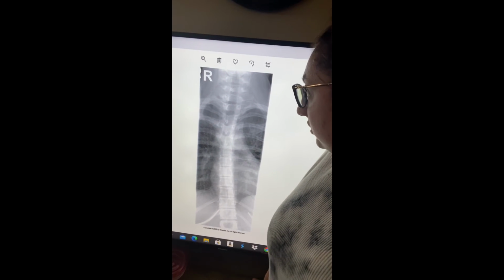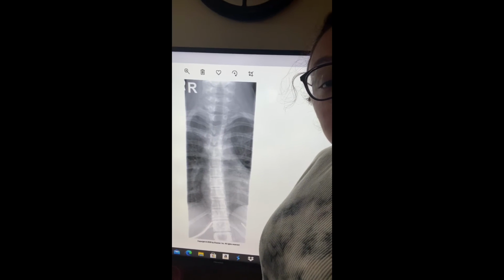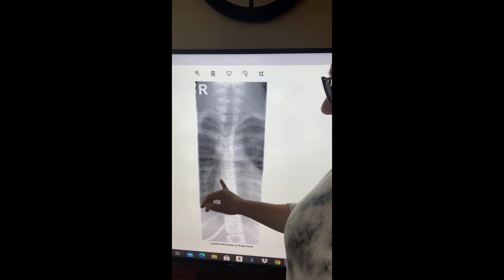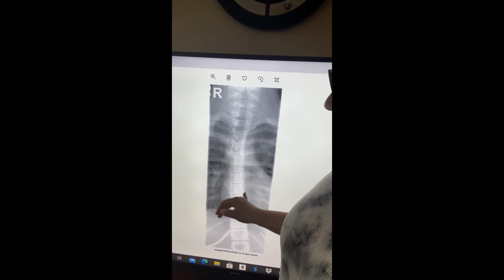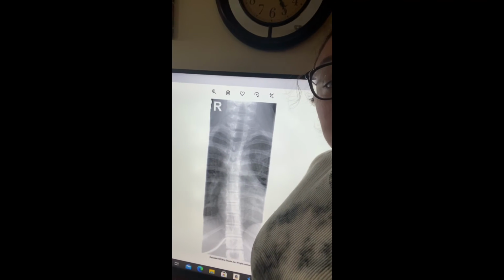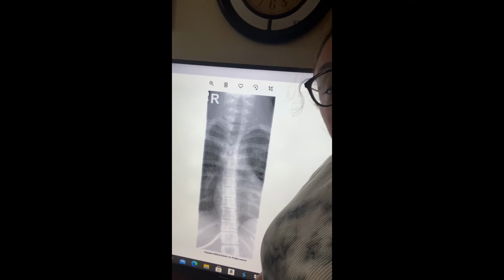The spatial resolution also I don't think is very well demonstrated in this image, just because it's very underexposed and you can't see much detail. Right here is where you can start to see the intervertebral joint spaces. And on an AP T-spine, they should be in profile all throughout. Also, this is another way to demonstrate rotation on the image, but also if they were penetrated correctly, it would help to be able to see them.